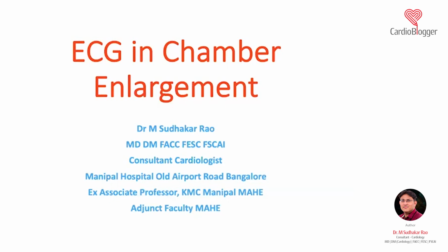So any disease where the right ventricle is enlarged invariably leads to right atrial enlargement, and any disease where right atrial enlargement is there, there will invariably be right ventricular hypertrophy, except some organic tricuspid regurgitation. Now, the reason I am telling you all this is that many a time we see a normal ECG. When you see a normal ECG, you can tell that there are no chambers which are enlarged, that is the right atrium, left atrium, right ventricle, left ventricle.